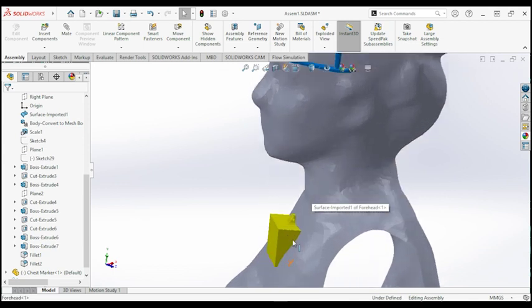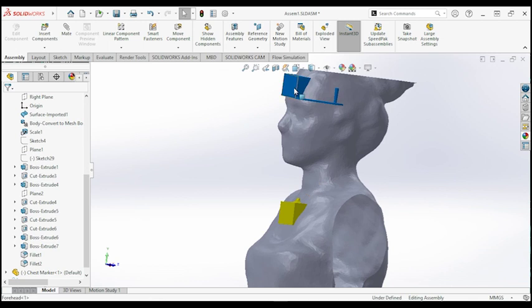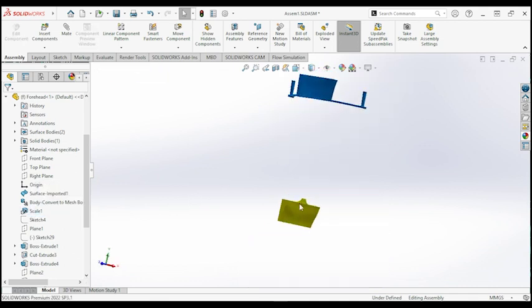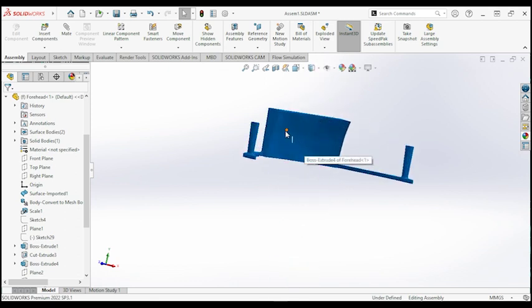As you can see, two markers are required for the purpose of neck movement measurements, one on the forehead and the other one on the chest. Removing the patient's body mesh, you can see the negative space provided specifically for the size of the forehead and the shape of the chest accordingly.